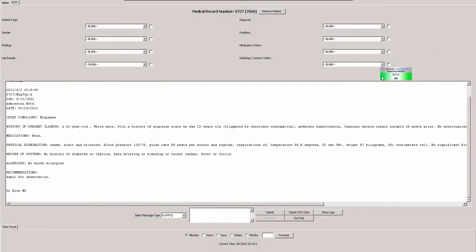So let's see how it works. The advisor floats on the organization's EMR and can be easily positioned on the screen wherever you like. The advisor's basic steady state status is OK, green, indicating that there's no deficiency in the approach to the patient, with all aspects that relate to compliance with the radiology guidelines as indicated by the government and the organization.